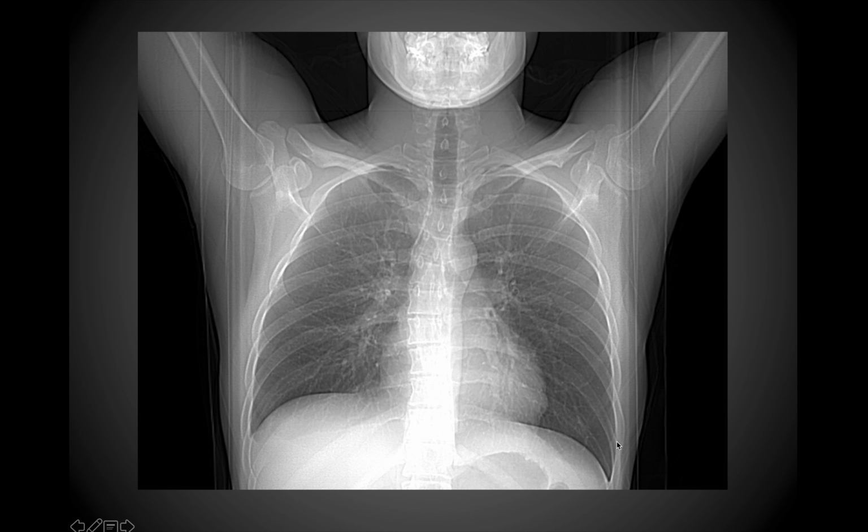Notice the angulation here on the costodiaphragmatic recess. So there is actually an abnormality in the scan, and over here you see that on the right side. Notice that the costodiaphragmatic recess on the right side is blunted. So when you get blunting of one of the costodiaphragmatic recesses, that indicates a likely pleural effusion. Usually fluid is accumulated in that recess and has caused blunting of it, so you don't get this nice sharp appearance of it that's as deep when you have that fluid filling that space.